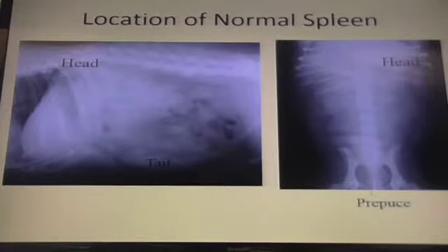And that is why we do right side down for the abdomen. When we do right side down for the abdomen, it displaces the tail of the spleen caudally, so you can see the separation between the liver and the tail of the spleen. Left side down, sometimes the tail of the spleen will move cranially, and you see it right up against the caudal margin of the liver. And sometimes it's difficult to tell if you're looking at the tail of the spleen adjacent to the liver, or are you looking at all liver? And then you don't want to misdiagnose that as hepatomegaly.